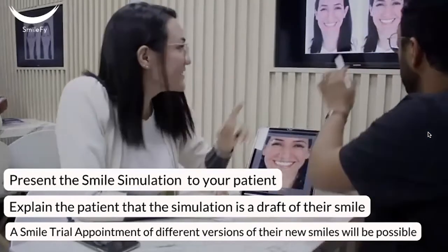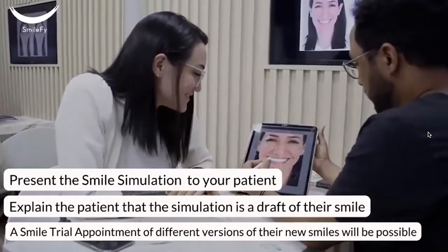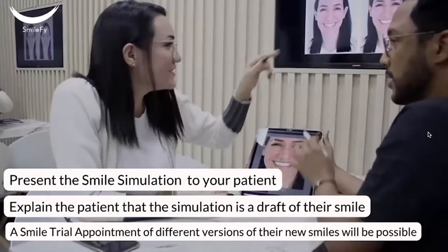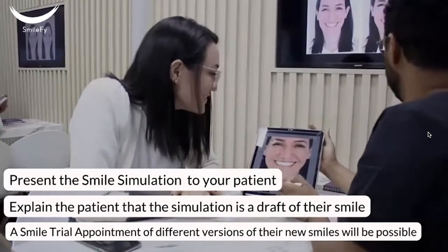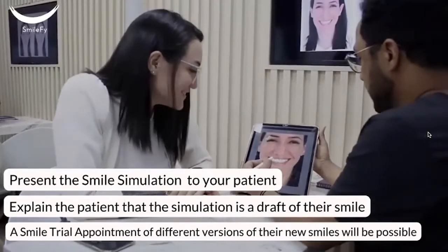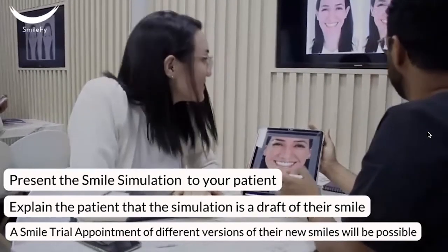So here it's just an example showing how you can present your SMILE simulations to your patient. You can share that before and after picture and place it on your television. And you can use the iPad or the iPhone to educate your patient on the SMILE draft that you did on SmileFy.